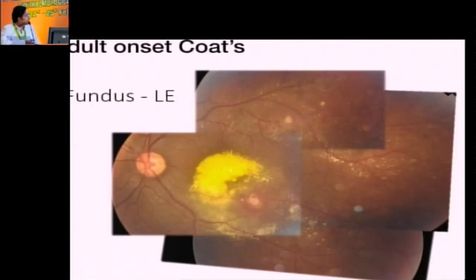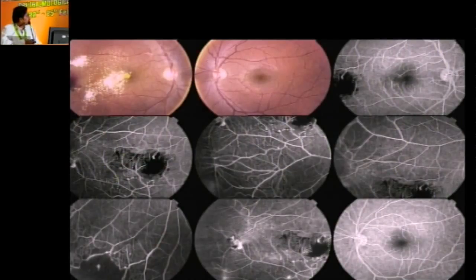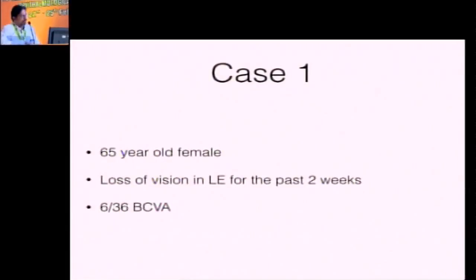And sometimes there are mimickers of diabetic retinopathy, where we need not directly jump to a diagnosis of diabetic retinopathy. You can see that there are some cases like telangiectatic vessels, and these need to be targeted. We need not go for a PRP, only target these areas and it will resolve. Again, one more case we see showing only localized non-perfusion and aneurysmal dilatation.